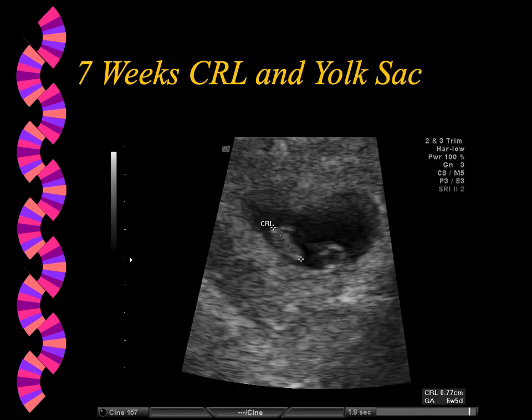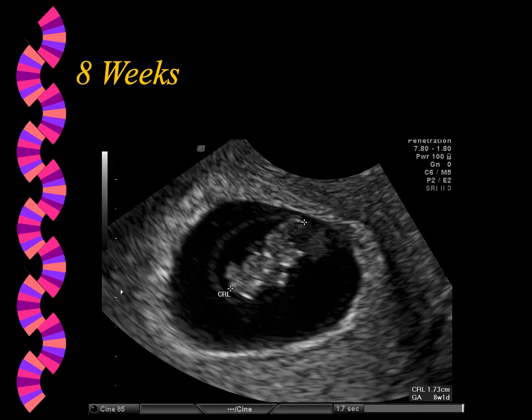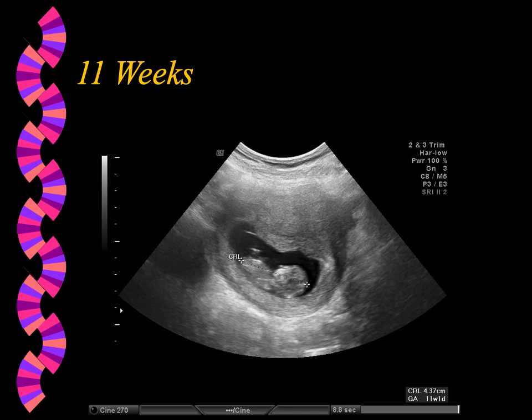By 7 weeks, we see both the crown rump length and the yolk sac, and we certainly should be able to see fetal cardiac activity there. At 8 weeks, you can see the crown rump length, and you can actually sort of see the amnion surrounding the fetus, the embryo actually at this gestational age. And then at 11 weeks, we can clearly see the crown rump length, and it's already up to 4.4 centimeters. And now at this point, there is no longer seen a yolk sac. The placenta will be taking over.